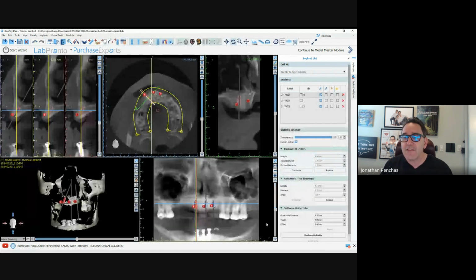They could be guides for implant placement, or they can be guides for endodontic placement. And endodontic placement means that you order a guide that has the exact drilling spots where you would drill until you reach the canal. Why do I need it? I'm not sure I can find MB2, or I have calcified canals and I don't think I can find them.